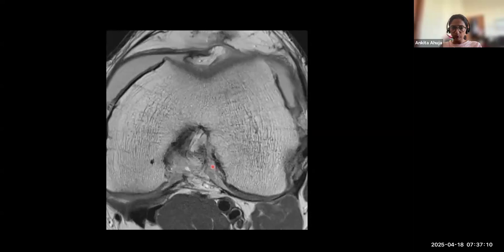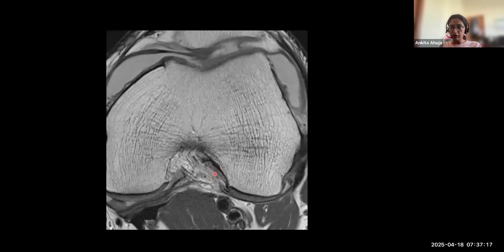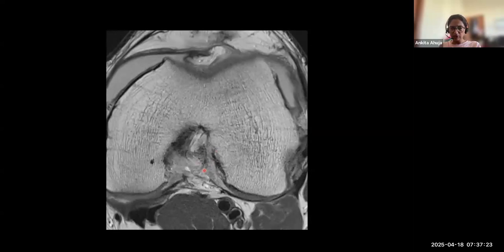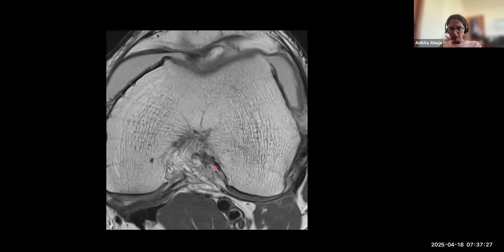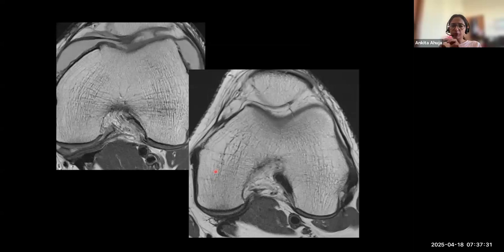I'm moving towards the femoral attachment, and as I move towards the femoral attachment, I do not see a significant ligament. I told you it should be seen as black and robust. It is nothing which we see over here. Proximal third completely gone. Femoral attachment, barely this one fiber over here, but nothing major. So it's predominantly a femoral attachment and a proximal third injury.